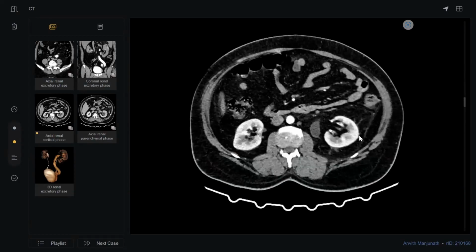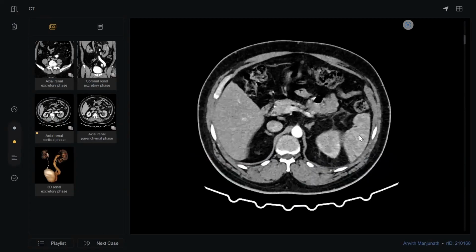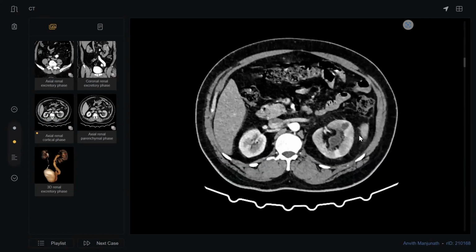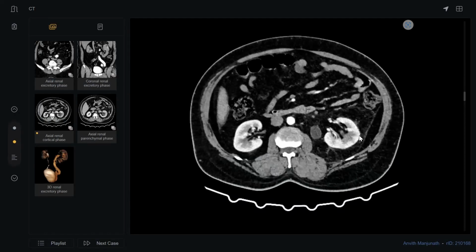You made another mistake here when you go up and down. See, my colleagues, when you catch the mouse, have a look. You can have a look slowly or rapidly as you like, but don't go up and down. It is very irritating.